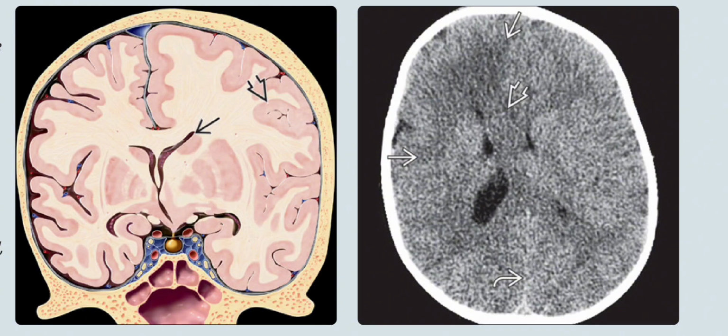The right image is the axial non-contrast CT scan in a 4-year-old female with intractable seizures, and it shows the enlarged right hemisphere, hemicranium, with enlarged white matter in the corona radiata, and ipsilateral corpus callosum, as well as the fornix. The fornix is displaced across the midline.